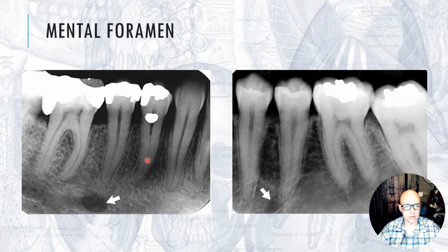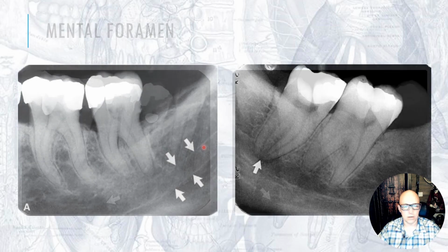Hopefully you know this one, mental foramen. So don't mistake this for pathology. Don't mistake it for an inflammatory lesion. Always be on the lookout for the mental foramen. You'll see it a lot and you'll get used to it. All right, what do we have here?